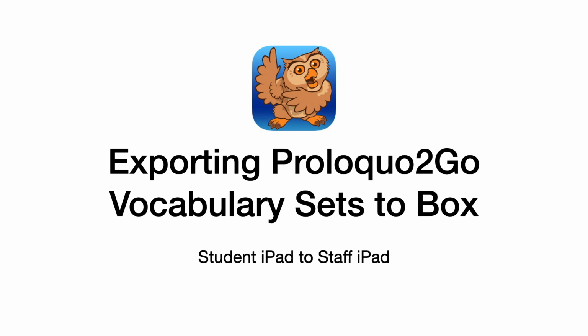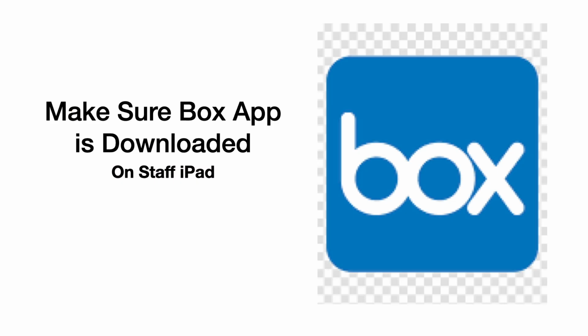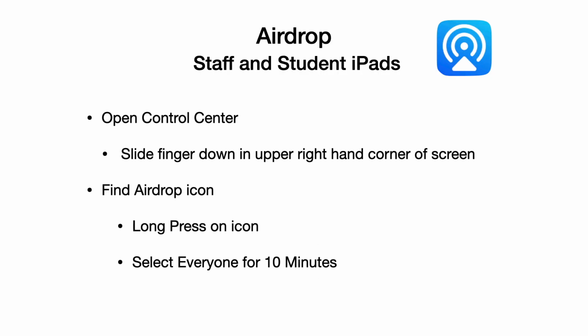Okay, before we get into the export piece, there's a couple of things we need to do just to make sure this whole process goes smoothly. The first one is, on the staff iPad, ensure that you have the Box app downloaded. You can get that from self-service if you haven't done that already, and make sure you sign into it as well. The next thing you're going to need to do is make sure AirDrop is turned on both the staff and the student iPad.